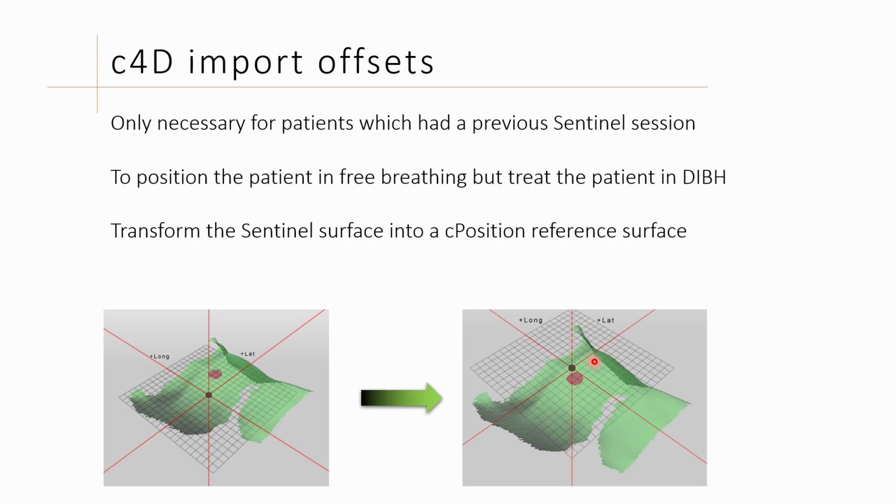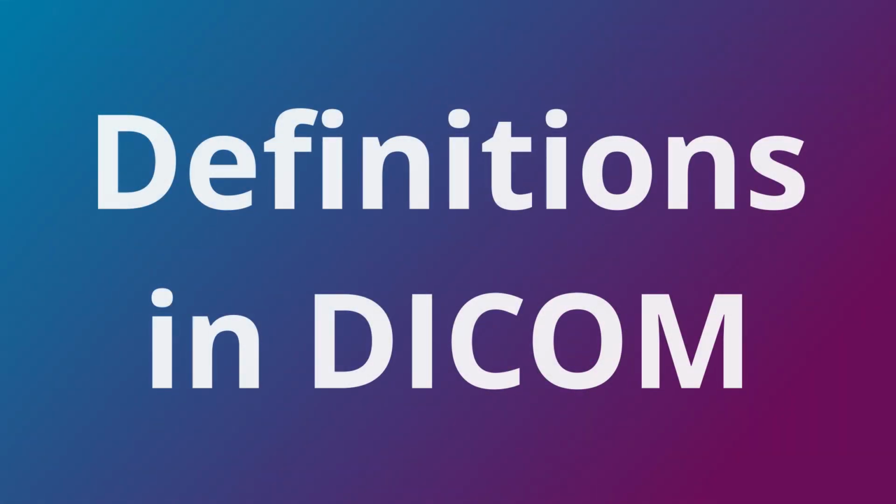In this video, you will learn all the aspects of this topic and how you can handle these additional offsets that might occur. Before we go into details about offset import, let me start with some explanations and definitions to avoid misunderstandings.